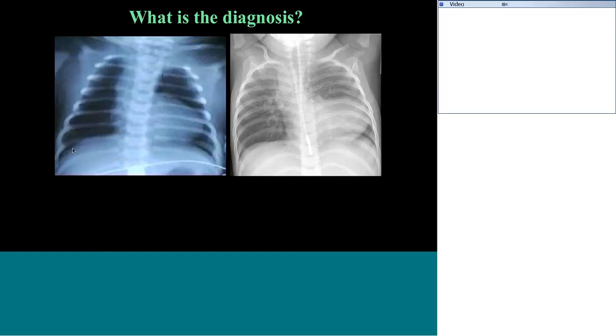Okay, but what's the difference between the X-ray on the right and on the left? Tetralogy of Fallot is right. Why do you call it tetralogy of Fallot? Yeah, oligemia with the boot-shaped heart, and in the left one, what is that? Anything else that you notice? Boot-shaped heart is right, oligemia is right. Anything else? Absent pulmonary, pulmonary bay is empty, that's fine. Okay, pulmonary bay is empty in both, that's fine. Anything else?